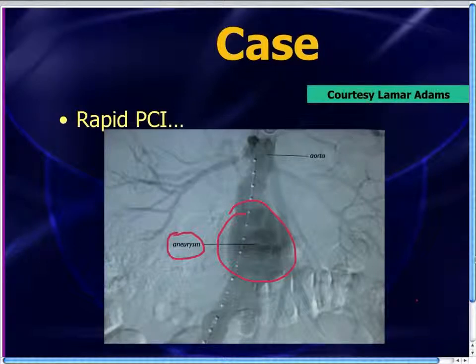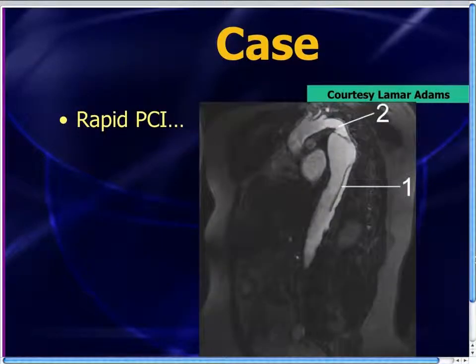the patient's got a thoracic aneurysm, and squirt some more dye, it turned out that she's got a dissection through that aneurysm as well. And it was a fairly extensive one. This is also off the internet, by the way, not a real picture from this patient. So this patient had a dissecting aneurysm.